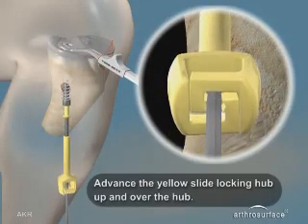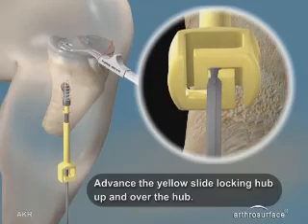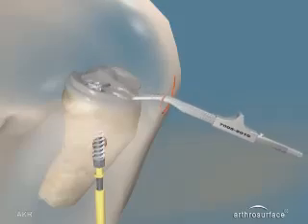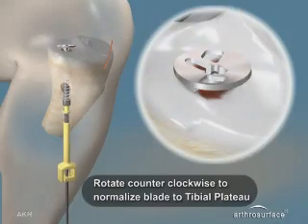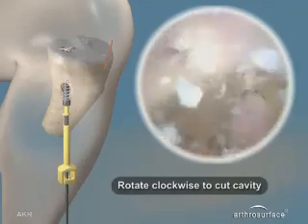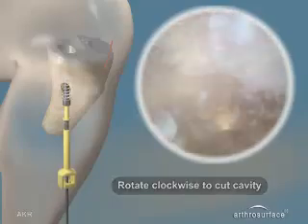To lock the blade, advance the yellow slide locking hub up and over the hub and release the lock. Remove the tibial blade holder. Begin counterclockwise rotation of the blade to normalize the blade to the tibial plateau, and then clockwise rotation will cut the cavity. Continue until the blade is stopped by the proximal end of the blade stop.